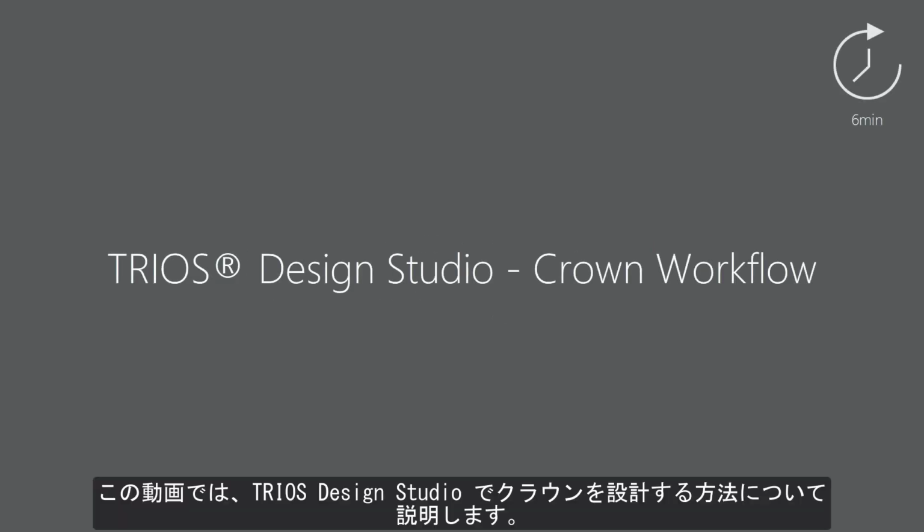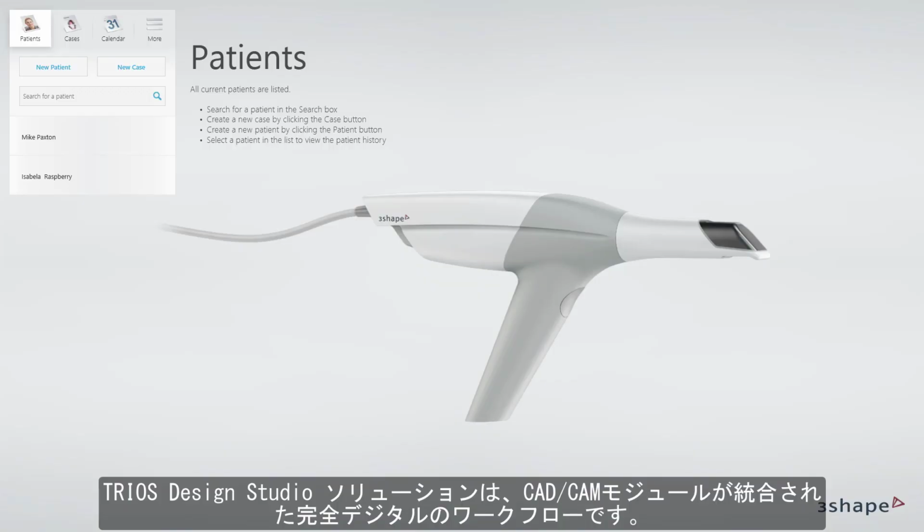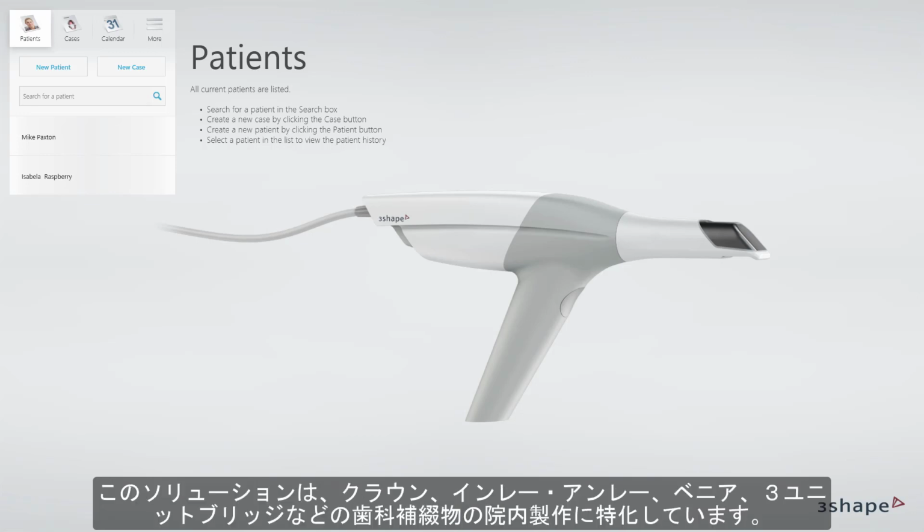In this video, you will learn about TRIOS Design Studio Crown workflow. The TRIOS Design Studio solution is a complete digital workflow with fully integrated CAD/CAM modules. This solution is dedicated to dental practices that would like to produce restorations like crowns, inlay-onlays, veneers, and bridges in-house.